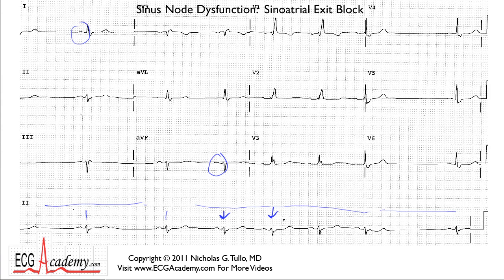And here you have 300, 150, 100, 75, 60, maybe about 58 beats per minute. So you have this regular rhythm, 58 beats per minute, looks like a perfectly normal sinus rhythm, and then suddenly you have this pause. Now this is the important part. If you take a pair of calipers, and you can move these around here, right? Okay, let's just take the P waves and measure the P wave intervals. Remember, try to do the beginning of the P wave because sometimes the top part may be arbitrary. So you have a pretty regular rhythm that's going on here.